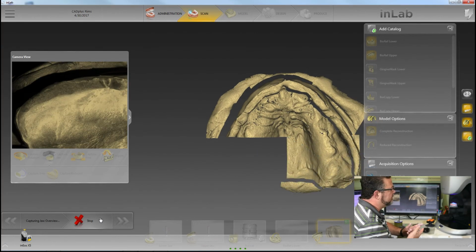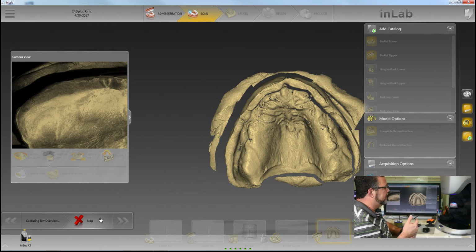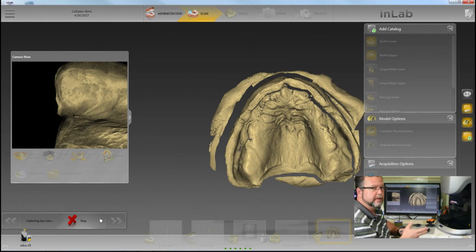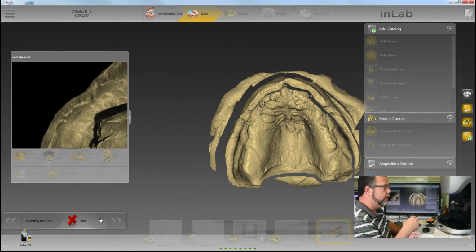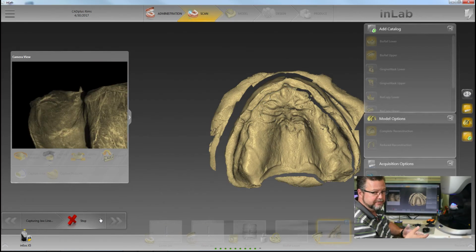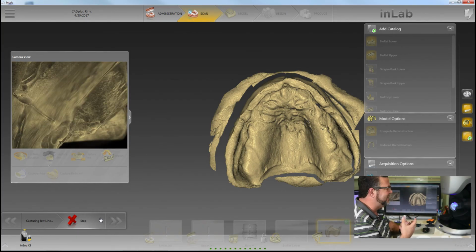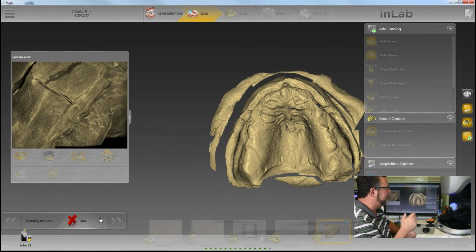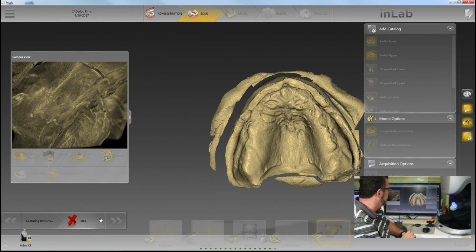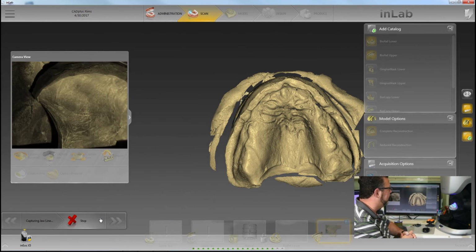Now, as you can see, the doctor did a reline type impression on these bite rims because we did not use a stabilized or milled base plate or something that was formed on the final model. A vacuum press bite or base plate is not stable enough and will not give a good enough final fit. So it's best to have the doctor just take a reline impression like this. That way the patient kind of knows how it's going to feel at the very end. Again, it's digital. We're going to mill this out.